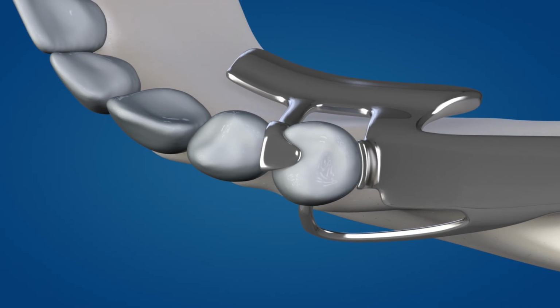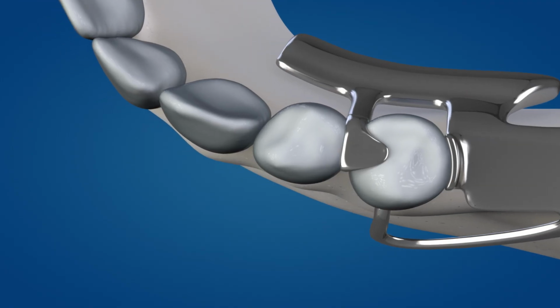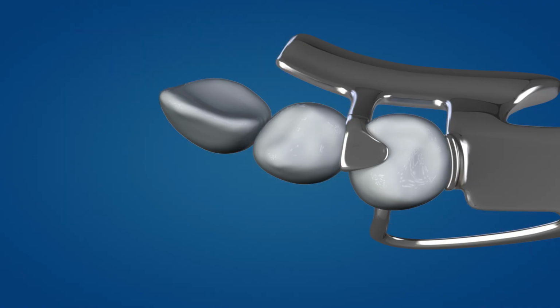To understand the rationale for this design, it is helpful to visualize the clasp assembly and its interactions with the abutment. As viewed from the occlusal, an I-bar or RPI assembly looks like this. For the sake of discussion, the mandible and anterior teeth will be removed, allowing us to concentrate on the remaining components of this assembly.